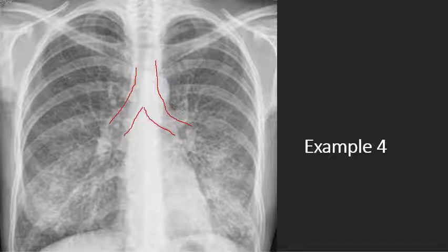His lungs look bad. And if in context the patient's not doing well, they need oxygen, and you can run some tests in the line of COVID and all of this stuff. This could be COVID, this could be miliary TB, this could be viral pneumonia. And in this case, it's viral pneumonia. This is a moderate to severe case. It's bad. This patient's sick. They're going to need some supportive care for sure.